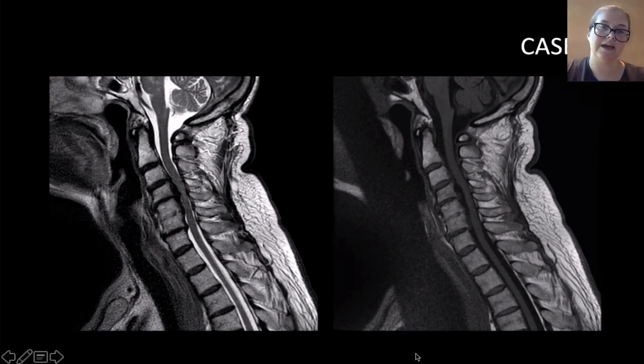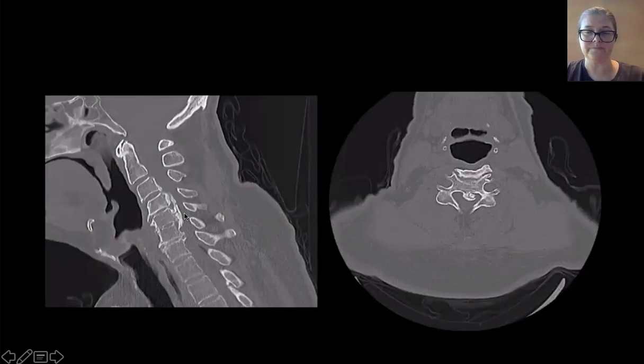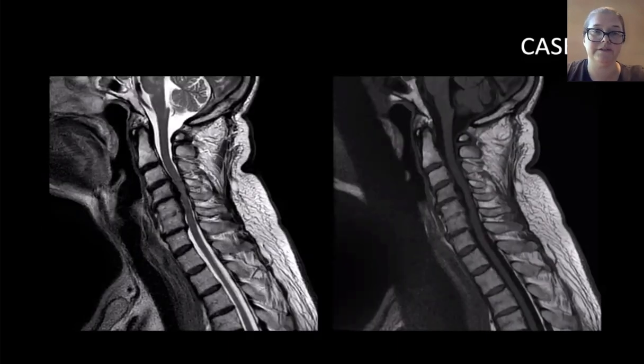So this is a case where you've got quite a bit of spinal canal stenosis. You've got some degenerative process here. Is this just disc? Could it be ossification of some other sort? Another thing I would suggest, if you ever have a concern on an MRI for ossification of the ligamentum flavum, it's fairly easy to get a CT to confirm.